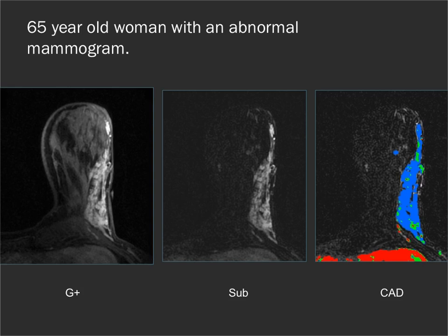This lady had about 3 centimeters of fine pleomorphic microcalcifications on her mammogram, which were biopsied and shown to be DCIS. But again, you can see that when you look at her MR, she's got a lot more than 3 centimeters going on, and she has a totally classical segmental type enhancement pattern showing here, and this was all DCIS. There were no invasive components at surgery.